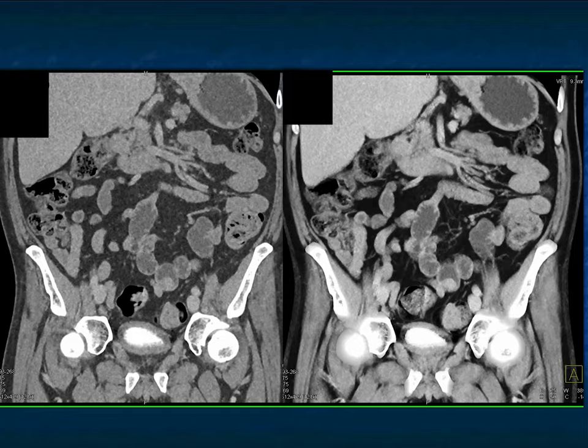And again, once I see that, it's harder to see. It looks a little bit like the first case I showed you. Again, the lesion washes out, but it's in the lumen. But then you say, well, is this a lesion? What's going on? I think you really need to see the enhancement to definitely call a lesion and not overcall things. Surgeons will typically, when they're solitary or even a couple lesions, go in and do a resection, and they'll follow the bowel, look very carefully for the presence of any other lesions.